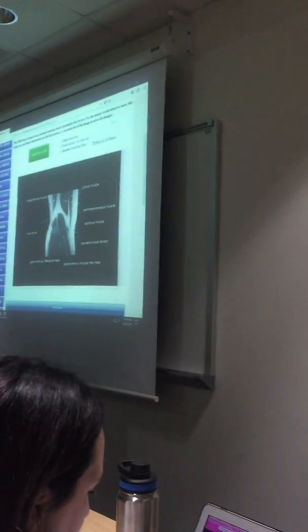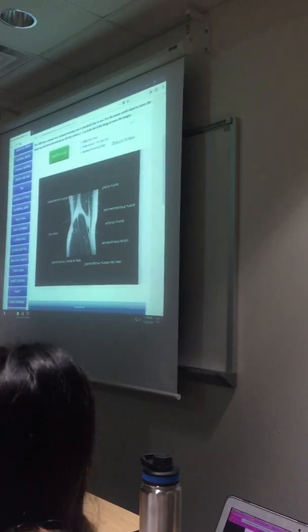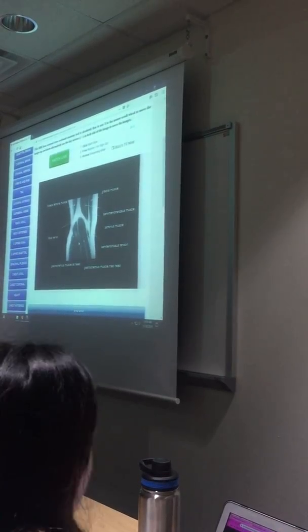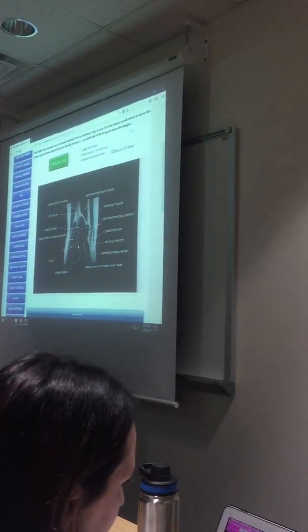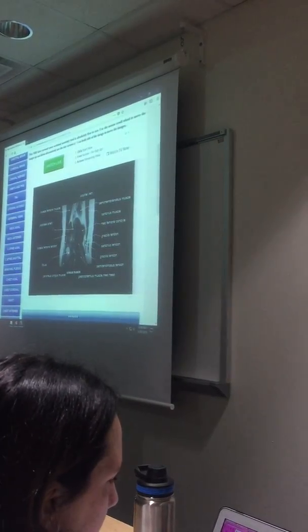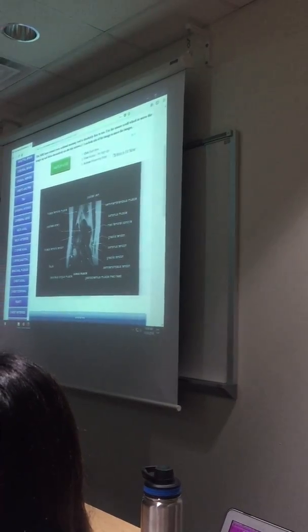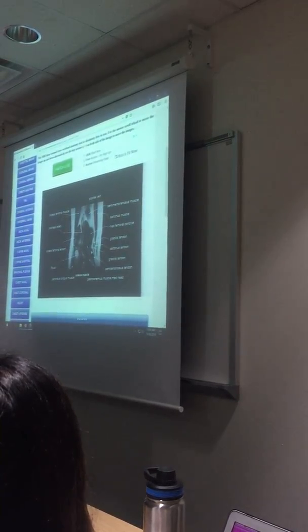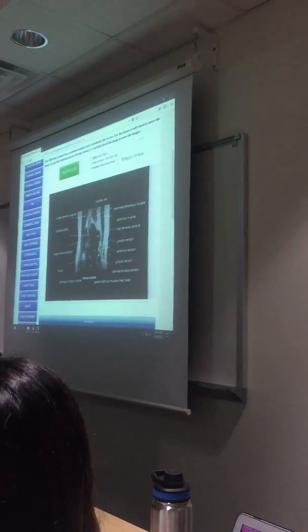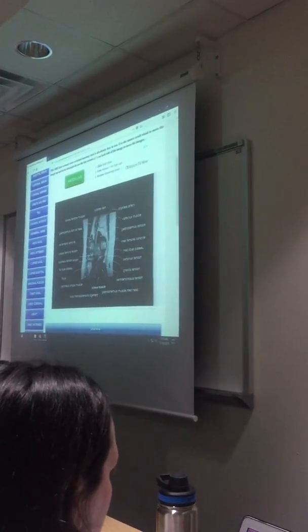We have this gastroc muscle. Remember, there's like two muscles. You have the lateral head and the medial head here. As we come anterior, and once I see my fibula, I know that's the lateral aspect of the knee. In your homework, though, you really only have one picture of the coronal plane, so it's not like you can page back and forth.